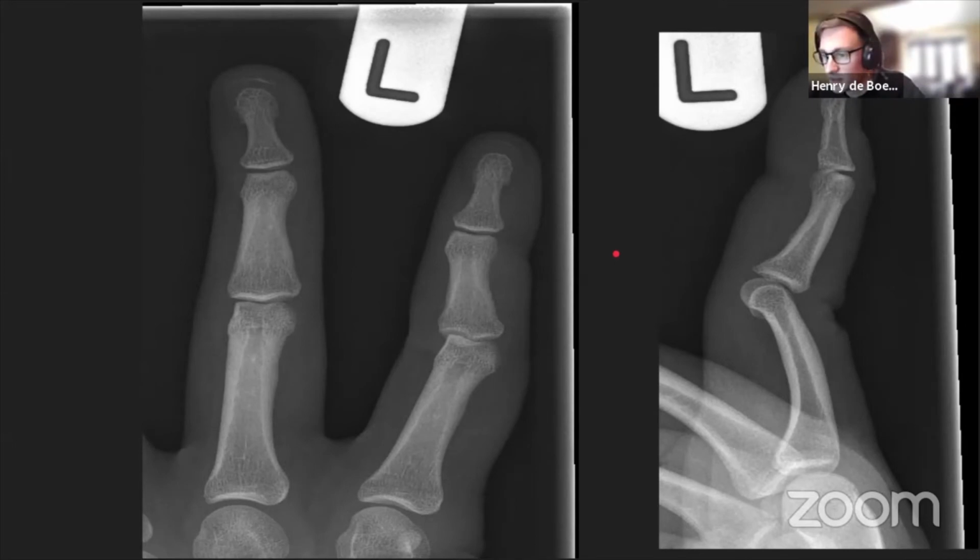So next case is similar. So I think we'll just talk through this one again together. So proximal to distal. No fracture, but the alignment here is not normal. This finger is normal, a nice straight line, everything aligning normally. But here, there is subluxation towards the ulnar side, and then coming back the other way. This is all wonky. And the joint space here, we should look straight through the joint space. It should be nice and clear, but here, it's just not right.